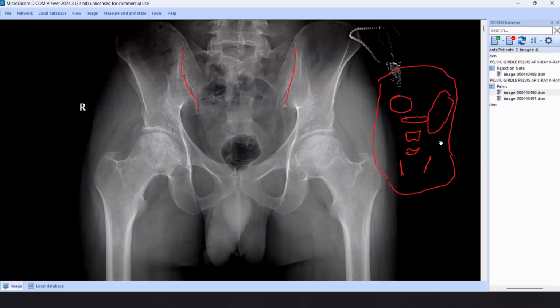Also, if we have an ileostomy bag, this one can raise the possibility of inflammatory bowel disease. If you have surgical clips in the pelvis, for example, here or here, you may have a history of renal transplant, and a renal transplant patient can receive long duration of corticosteroids in combination with immunosuppressant drugs. So all of these clues can help you to determine the causes of the avascular necrosis. If you find avascular necrosis in young adults or in a pediatric patient with Erlenmeyer flask-shaped femoral shaft, you can think of Gaucher disease. Okay? Thank you so much.